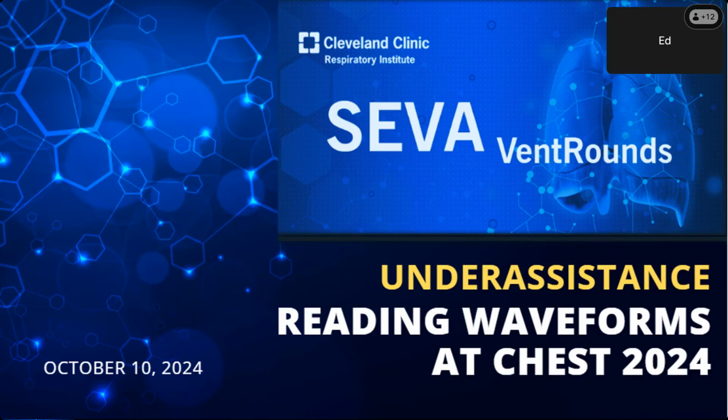So let's start our SEVA VentRounds today. We're going to try the topic of under-assistance, and we're going to do these reading waveforms from CHEST 2024. This is the second time we do it from here that it falls there. It's October 10th, 2024.